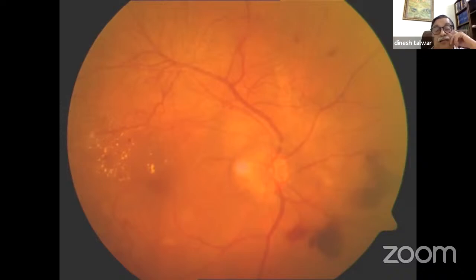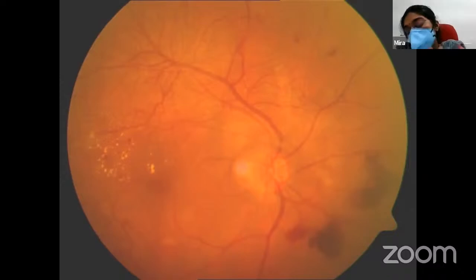Yeah, now go ahead to your next feature. We're talking about something else after that, no? After the macular edema? Infranasal as well as nasal to the disc, we can see intraretinal, we can see pre-retinal hemorrhages, sir. Okay. And also there are scattered blot hemorrhages in the superior quadrant, above the superior arcade. So this is suggestive of a proliferative diabetic retinopathy, sir.